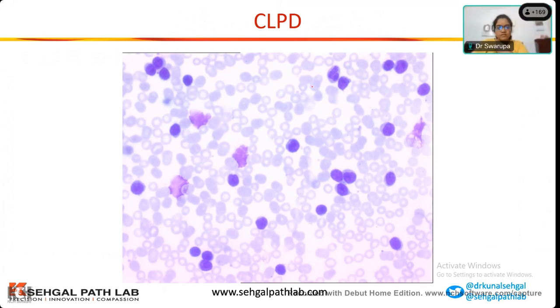What are you seeing? Mature lymphocytes. Lots of mature lymphocytes. So, what is your impression and interpretation and any advice to the patient or the clinician? Is this normal or abnormal? A chronic lymphoproliferative disorder, CLL, sir. Sir, there are some smudge cells also. So, smudge cells mean CLL.